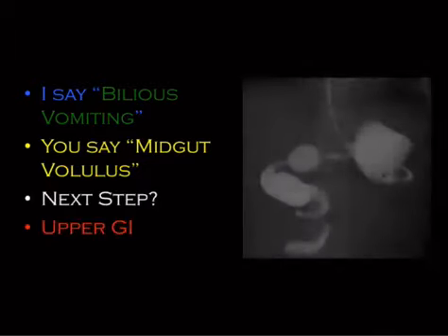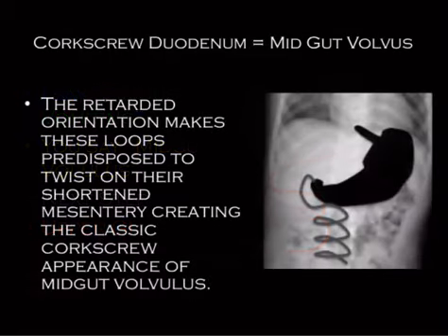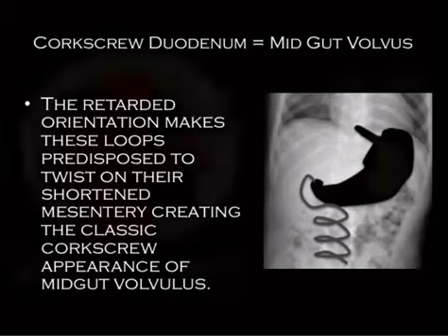You say upper GI. An upper GI for bilious vomiting that's going to have a midgut volvulus is going to have this corkscrewing duodenum. That is an emergency. That is a surgical emergency. Think about that like a closed loop obstruction. So people who are malrotated, it's more than just having small bowel all smashed on one side of their hemiabdomen. They also have a shortened mesenteric root, and because of that, you are susceptible for corkscrewing, and that's why they do that Ladd procedure where they go in there and they cut that and they create some adhesions and it mats it down. It's supposed to prevent a midgut volvulus, because people who are malrotated are susceptible to this. It's bad news. It can kill you because it's a closed loop obstruction. You can infarct your bowel.